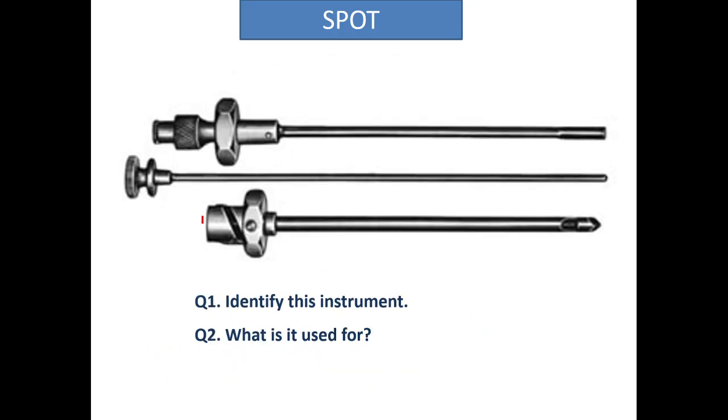Again, another needle. Try to see all types of bone marrow biopsy needles, bone marrow aspiration needles, and the LP needle. Don't confuse them and say in the exam that the LP needle is a bone marrow aspiration needle. So see the vintage types of these LP needles or bone marrow needles and how to differentiate them. See that.